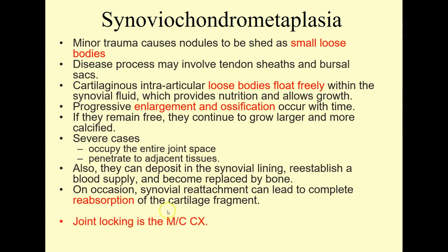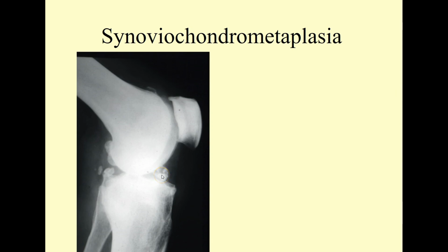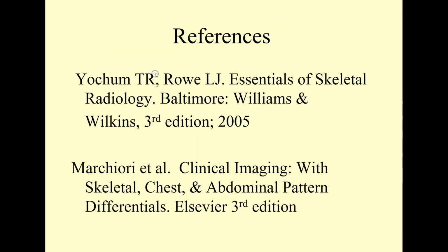And hopefully I've got enough reps on this now. This is a little more challenging because it's a smaller number. It really is more than you would commonly see in a post-traumatic production of a loose body. But you do have to stop and think, could this be post-traumatic? Well, the lateral view, particularly of the knee, is going to be the most helpful. When you have this many debris fragments, you are certainly going to be able to appreciate irregularity in the articular contour. And we don't see that at all in either the tibia or the better demonstrated femur. So in this smooth articular environment, it's easy to say, no, this is consistent with synovial chondrometaplasia.